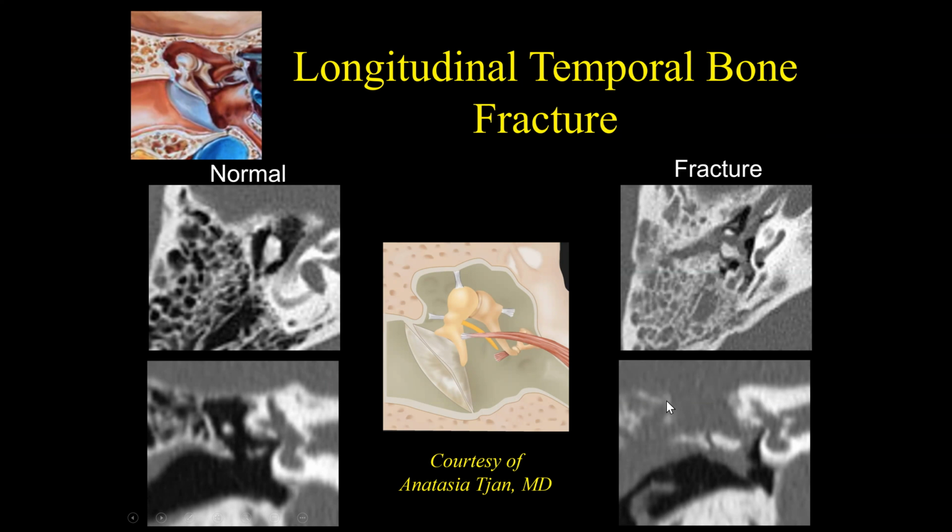And in this particular case, on this coronal image, we can see that there has been a fracture involving the tegmen tympani, and now there's herniation of brain contents inferiorly, which is resulting in not only incudomalleolar subluxation, but inferior displacement of the ossicles.